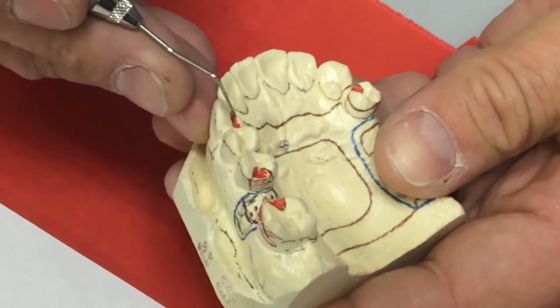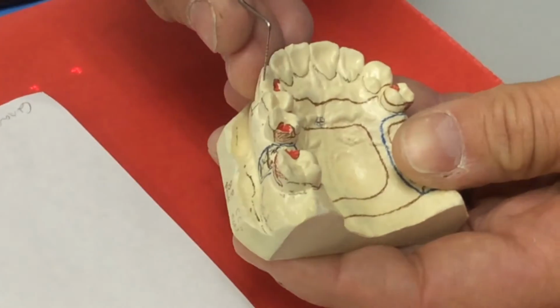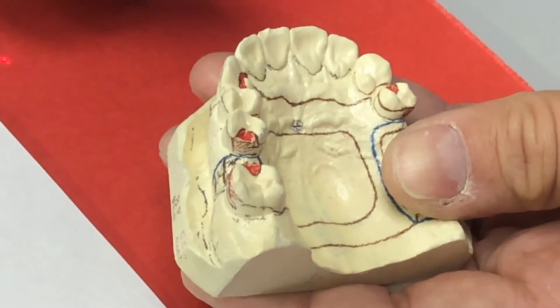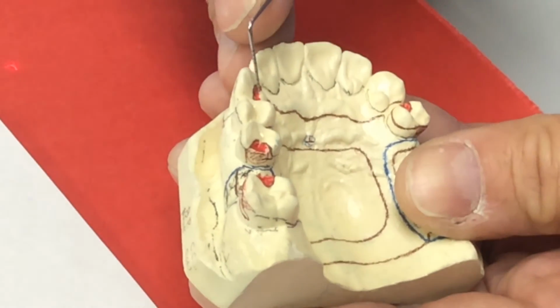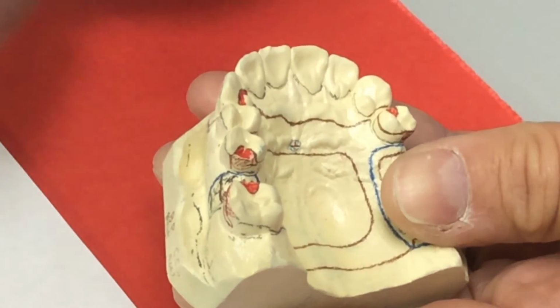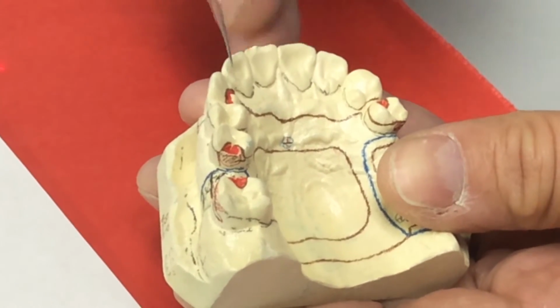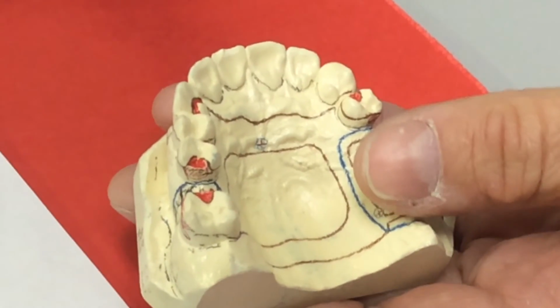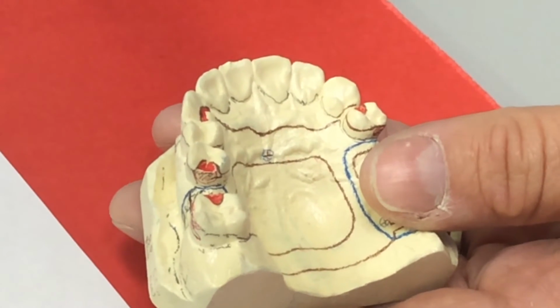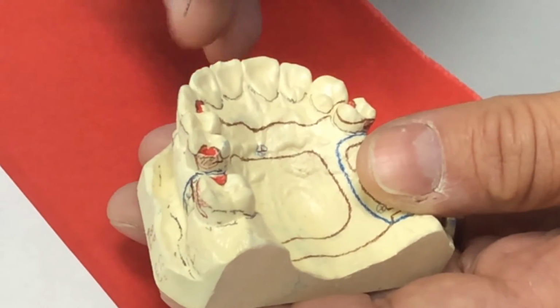When you go over top of a cingulum rest, on the lower, you should have scalloped that rest just the same as you scallop the plate around the other anterior teeth. The red portion of the cingulum should be underneath the metal, so it should be below the blue. Some of you put the blue down below and left the red up above it. The red is no longer incorporated into your framework. Just like putting a locator, where you put the male portion of the locator in the denture and the female portion in the implant, this is the same way.